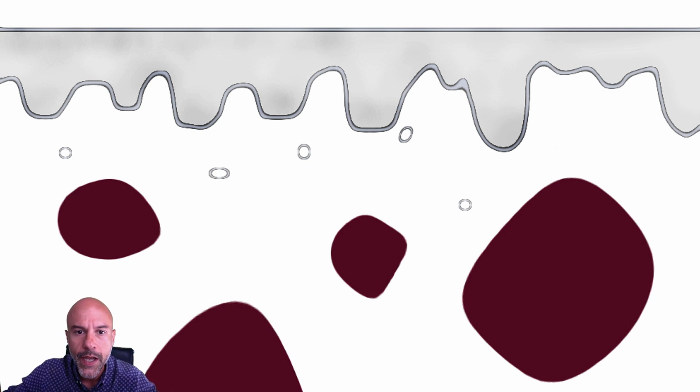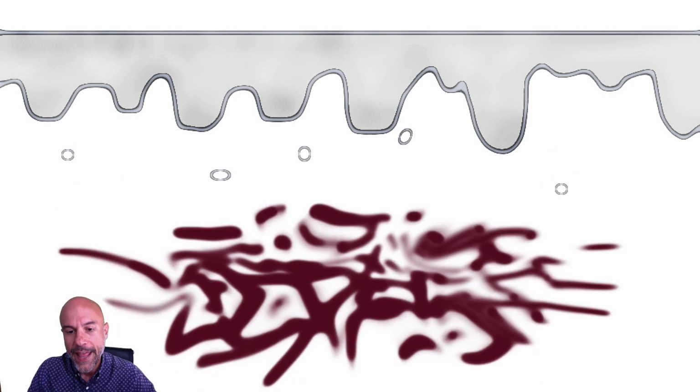So what do you expect to see dermatoscopically corresponding to this schematic? You expect to see large globules of what color? Blue. So nests, okay? In the next schematic, you see a diffuse presence of melanocytes in the dermis, but here there are no nests. It's just diffuse presence of melanocytes. What do you expect to see dermatoscopically? Diffuse blue coloration, no nests, no network, nothing else, just blue color, structureless, okay? And that's the case.